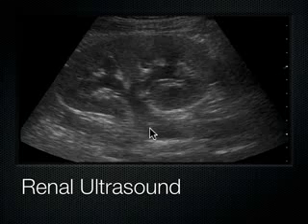And you don't see the ureters very well in ultrasound because the ureters are covered by bowel and fat and things like that, so they're really hard to see. They're very small usually. Unless they're dilated, then you can see them. So once the ureter exits the kidney, we no longer see it.